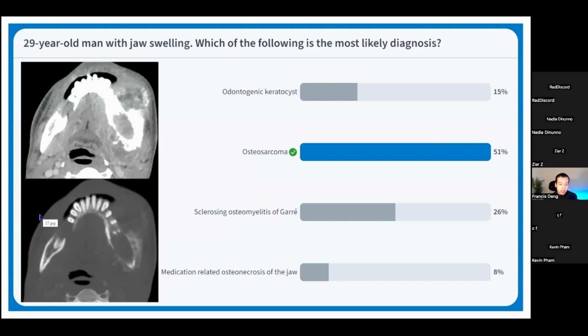What we see in this case is an aggressive bone destructive process centered in the left hemimandible, and it is associated with an aggressive periosteal reaction. Look at this sunburst type appearance. This is periosteal reaction that's perpendicular to the mandibular cortex. In addition, there's an abnormal soft tissue mass associated with this. And so this is most consistent with an osteosarcoma or other very aggressive primary bone lesion.